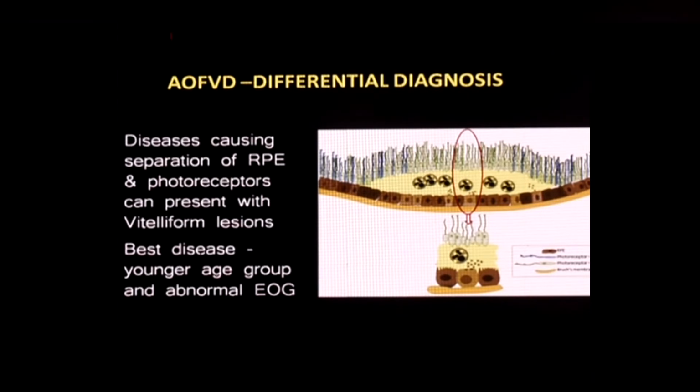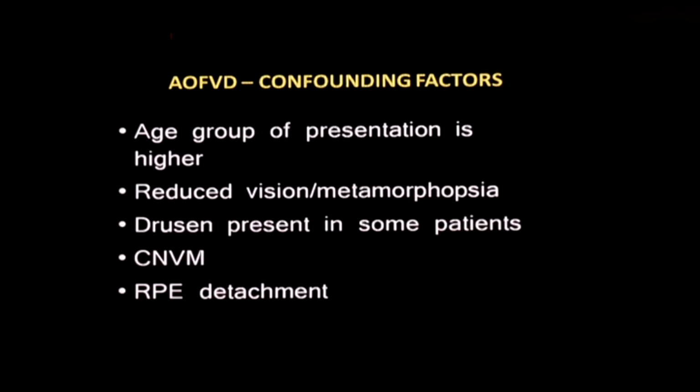But continuing on into the disease, there is both atrophy and death of the photoreceptors as well as the RPE cells. And that's when you see the collapse stage. So this is an example where you're visualizing the pathology with your imaging techniques.